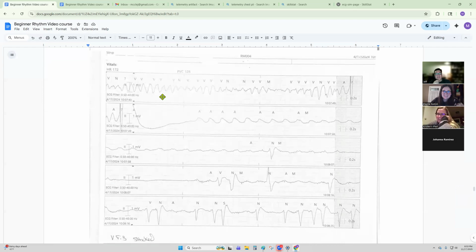Oh, here we go. So top is probably started out as torsades, and torsades is a very specific form of polymorphic VT. And polymorphic VT is that changing of amplitudes and morphology of the VTAC, right? Where monomorphic VT is a very consistent, regular QRS morphology of VTAC.